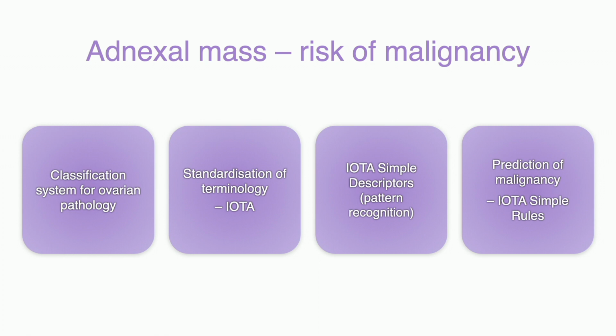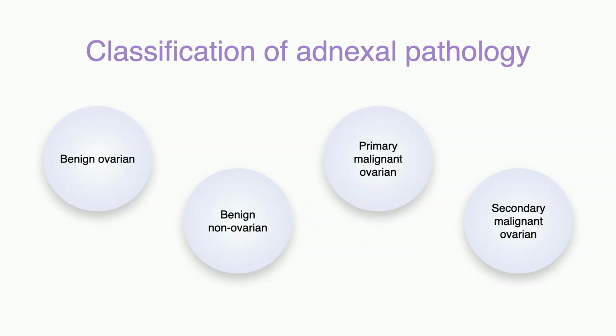There are different assessment approaches of adnexal masses. The first is using pattern recognition. That means you see a structure in ultrasound and should be able to make the diagnosis. The second approach uses risk prediction models with an emphasis on the IOTA simple rules. Adnexal masses can be categorized in these 4 groups. In this mini course, I want to focus on easy to diagnose and common findings.